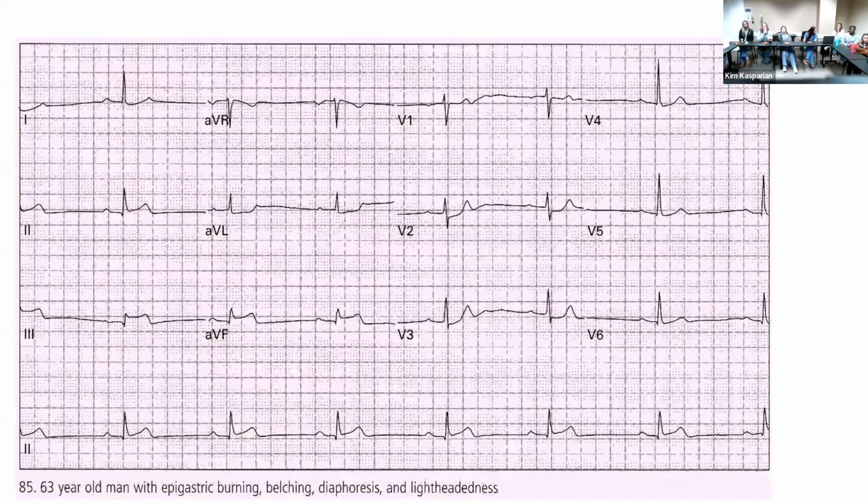All right. What do we see on this one? Oh, sorry. V2, no, that's not your fault. It's probably my eyes.